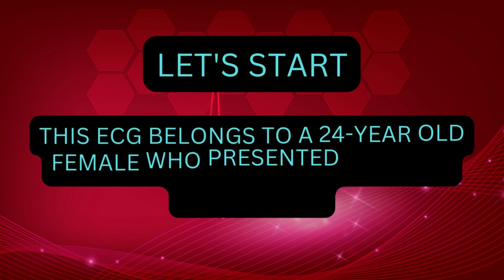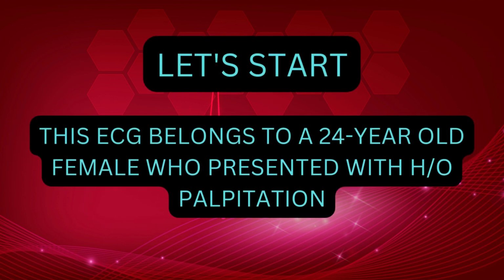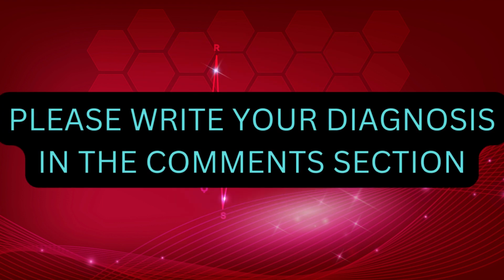Let's start. This ECG belongs to a 24-year-old female who presented with history of palpitations. Please write your diagnosis in the comments section.